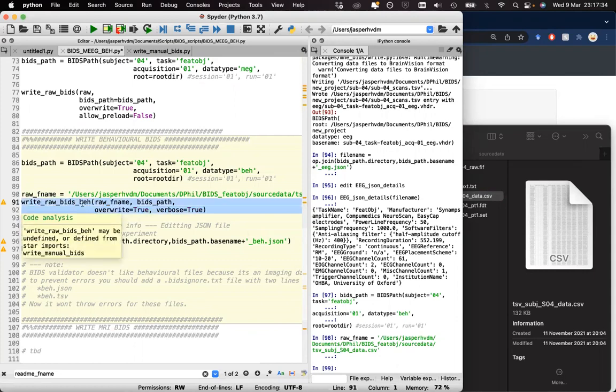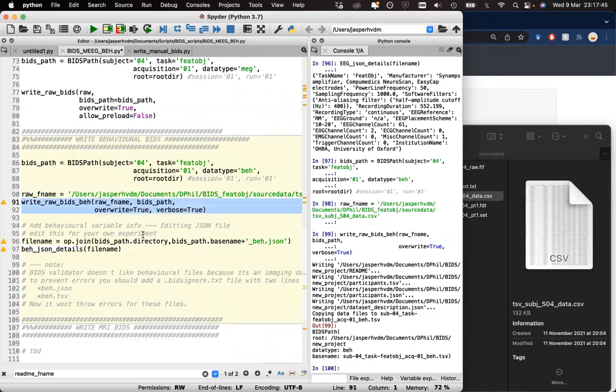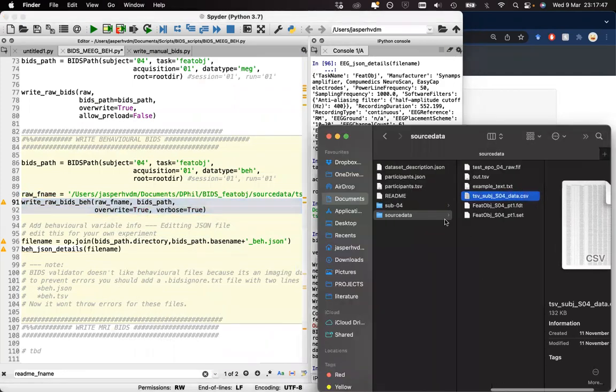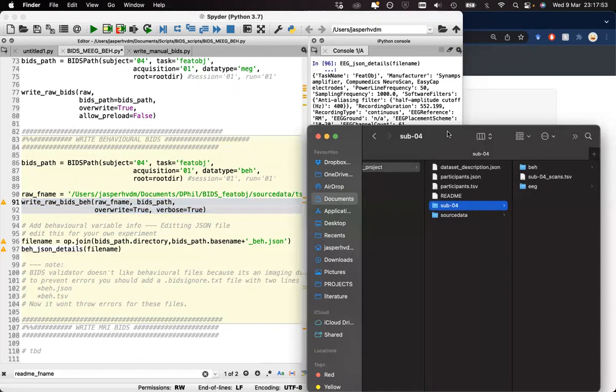In this case, this is a function that I have put together based on the existing scripts out there. So this is more of a customized function and is not fully compatible with BIDS yet. In the future, they might bring out different modalities like eye tracking, respiratory recordings, possibly also a better behavioral module. But until then, this is a function you could potentially use.